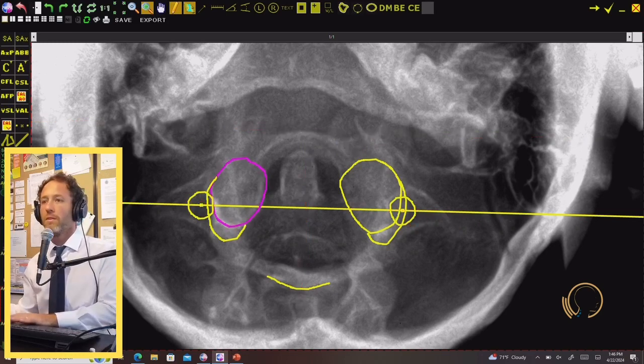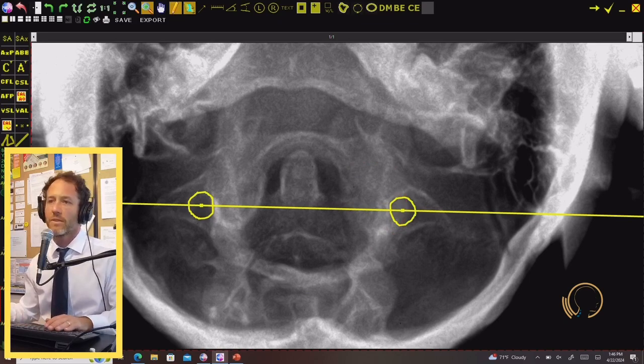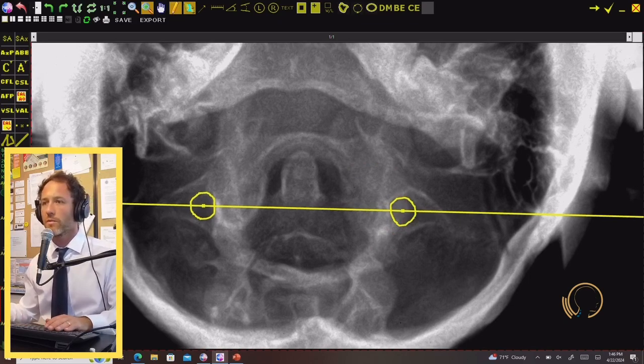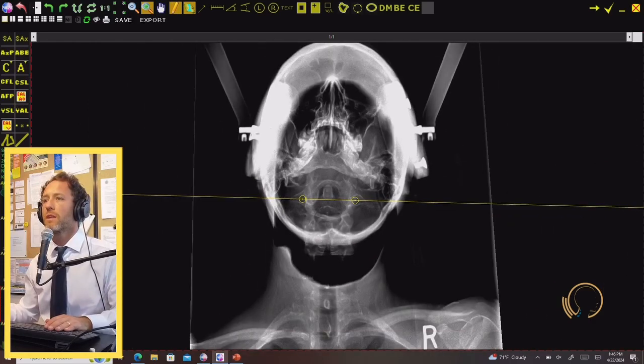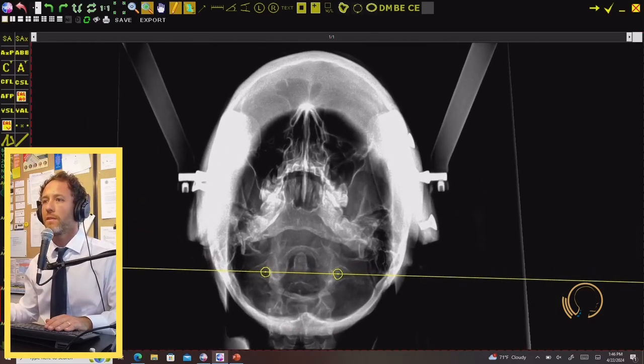Now, moving on, just to clean this up a bit here. And again, let's say you had one of those lines that just is not adding up. You scrap that and you go with majority rules. You go with the other three. So let's do that horizontal cephalic line, which is typically what I start off with.